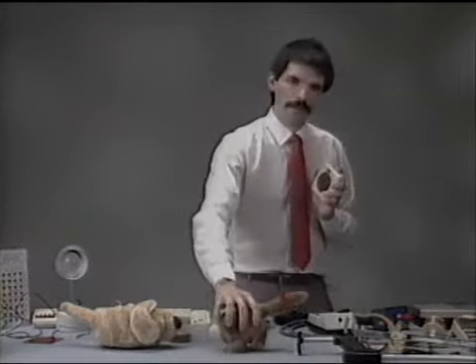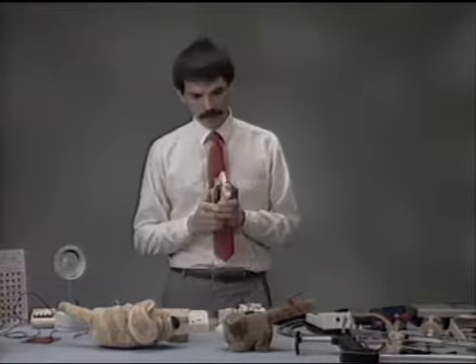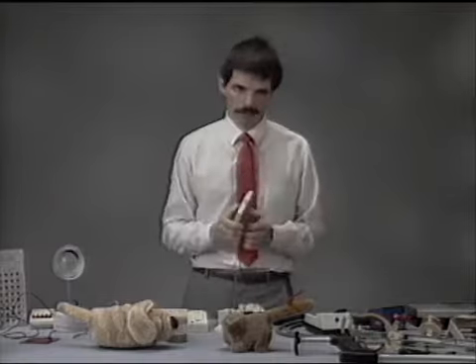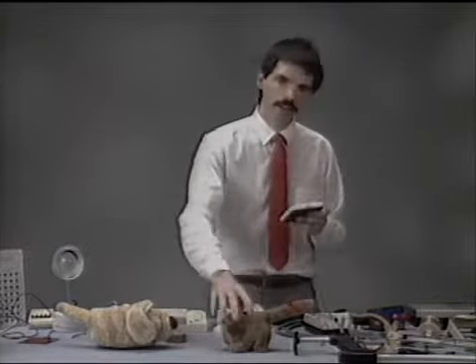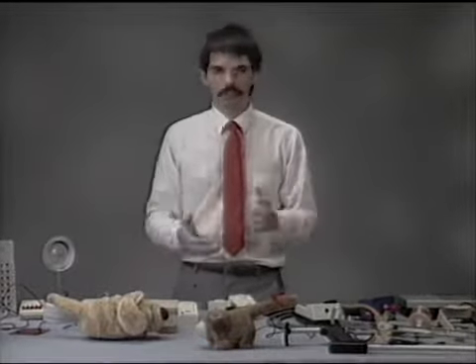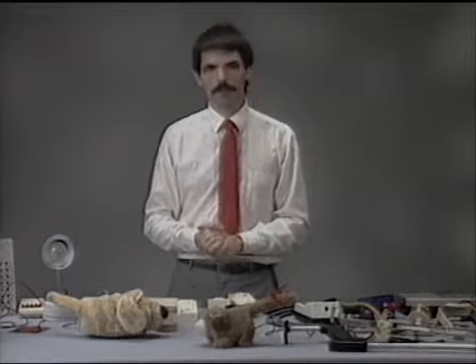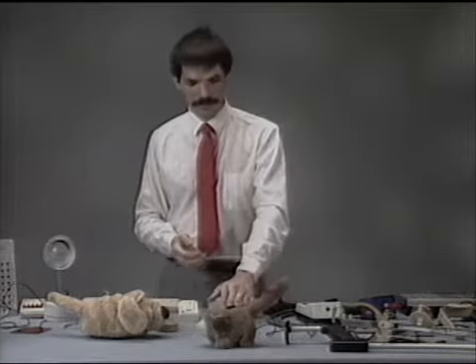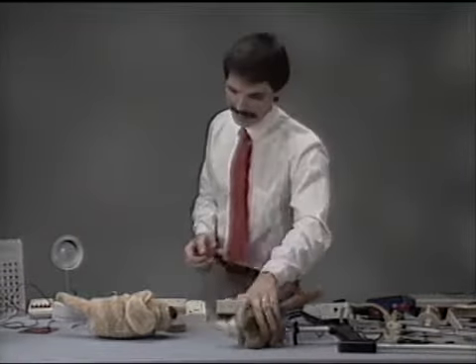For children, it's a very early type of environmental control, but it gives them an idea that they can, first of all, react with things in their environment, that they can control things in their environment, rather than having all these things just plopped in their laps and done for them. It's also, obviously, a great way to play. I can spend hours watching this guy's tail go.